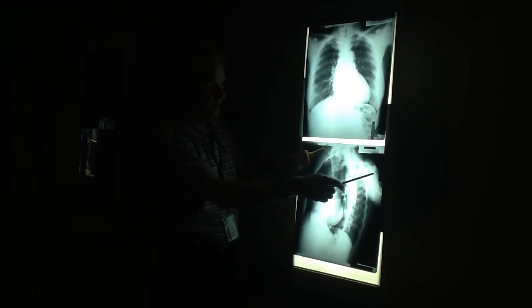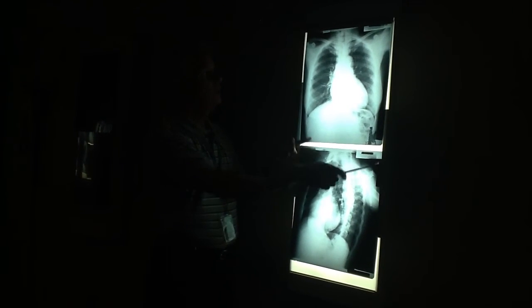Now, look at which shoulders we're seeing and which lung we're seeing. There's a shoulder, there's a shoulder. Shoulder laterality does not change. Do you understand what that means? Okay, there's your shoulder laterality. If I do this, did the shoulder laterality change? No. This is always the left shoulder and this is always the right one.